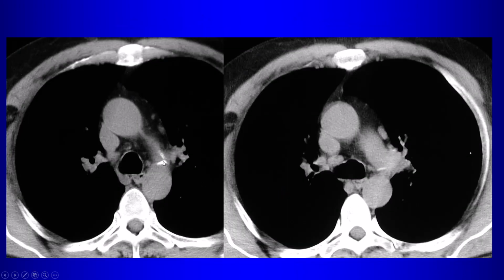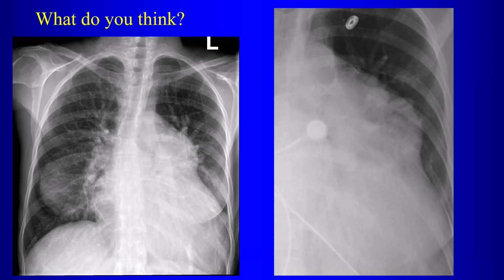More examples, calcification here of the ligamentum arteriosum, very common finding if you look for it. Actually, it's this linear calcification right here. That is the calcification there of the ligamentum arteriosum. And as I've said, it's a very common finding if we look for it on CT.